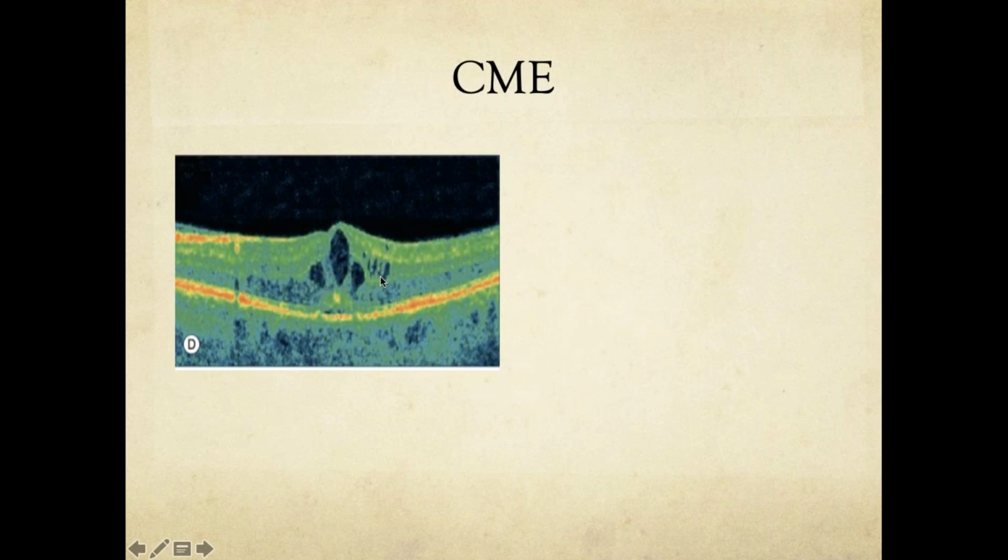And over here, if you look closely, the cystoid spaces are slowly starting to split the fibers. These are the wires, you see. These are the plexiform layers, and the spaces between these plexiform layers are being occupied by the fluid.